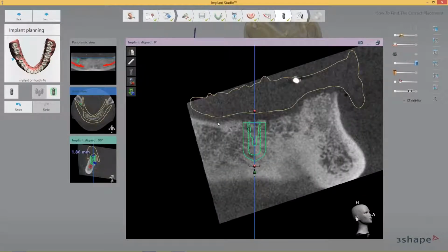So it will be positioned straight with the bone. This is to avoid angulated abutments and the problems that can come from that. So when doing digital, we can actually go for the perfect positioning at once if we are able to. So we have the first one positioned, and the length and size and everything is good there.